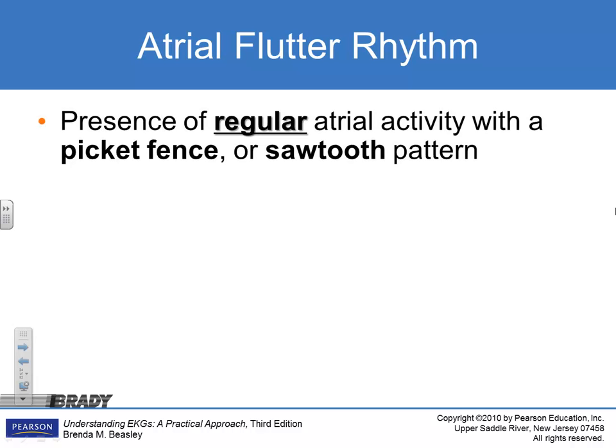Okay, atrial flutter. I love this rhythm. It's just kind of pretty. We do not see it very frequently, not as much as we see atrial fib and some of the others. But when you see it, you usually recognize it. It's very attractive. It has a very sawtooth pattern to the P waves.